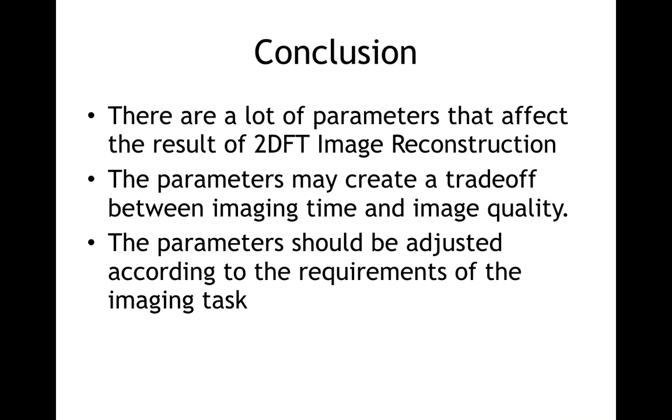There are a lot of parameters that affect the result of 2DFT image reconstruction. It is worth noting that most of these parameters have an effect on the imaging time in real life, which creates a trade-off with image quality. Increasing TR is just a mathematical operation in MATLAB, however it directly affects the total scanning time in real life, so it could be harder to eliminate the effect of T1 relaxation in real life.